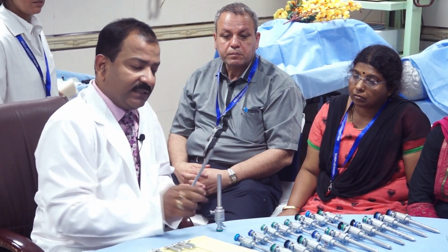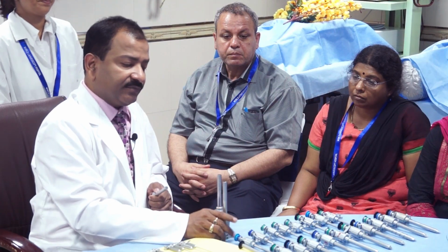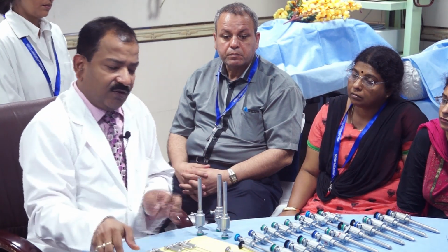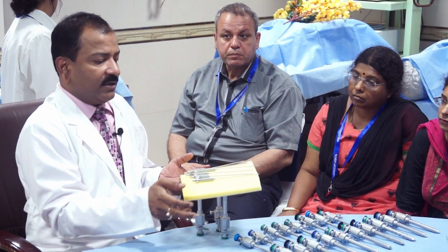Before starting laparoscopy, we should learn that laparoscopy has three important pillars. If you want to become a good laparoscopic surgeon, then you have to put 3 disciplines in your life. First is ergonomics, second is task analysis, and third is engineering. These are the 3 important ones. If any one is missing, you are not a complete laparoscopic surgeon. These are the 3 pillars, and then you can put anything over them and it will be stable. If any of them is broken, it will fall.